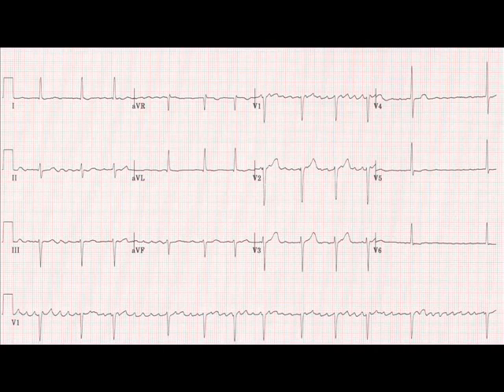Here's the first example, and imagine that this has been handed to you by a colleague in clinical practice who says, what's on this recording? Which is a fair question. Well, to answer that, work systematically. First of all, ascertain that it has been recorded accurately, and as you know, if you're in any doubt and you're able to, re-record it.